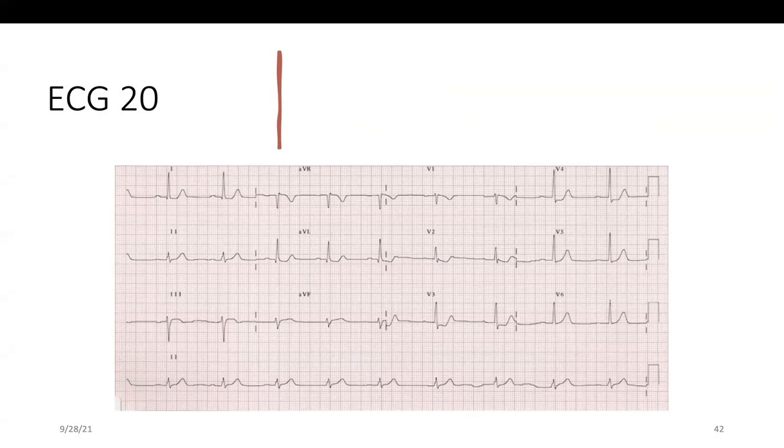Yes, doctor, there's ST depression with the hyperacute T wave elevation in V2, V3, V4, V5. I think this is going with De Winter. Okay, so let's take it one by one again. What do you see in V1 and V2 to V3?